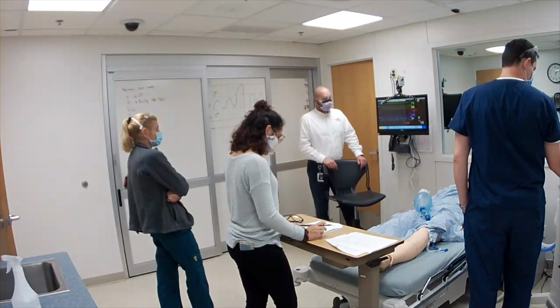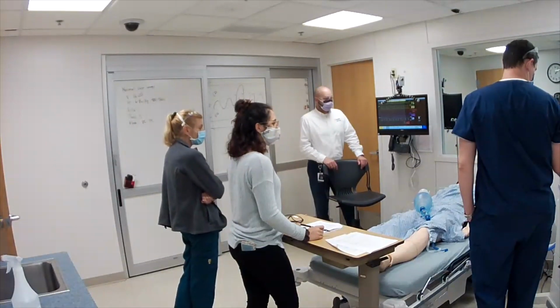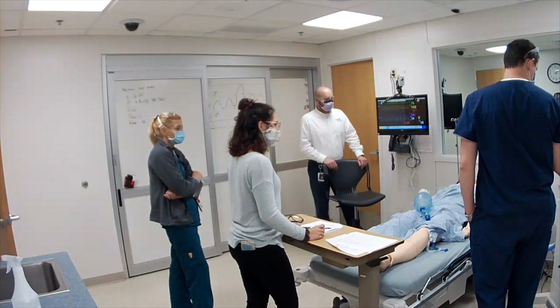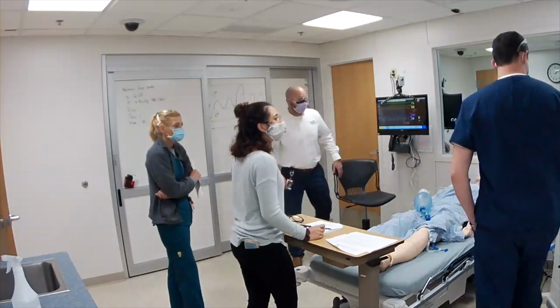So, all right, let's talk about it here. What's the first one? PEEP tot. It's like a tater tot, not nearly as delicious, right? What is a PEEP tot? Total PEEP. So this is static, measuring our expiratory hold, and this is his PEEP. Okay. What else?